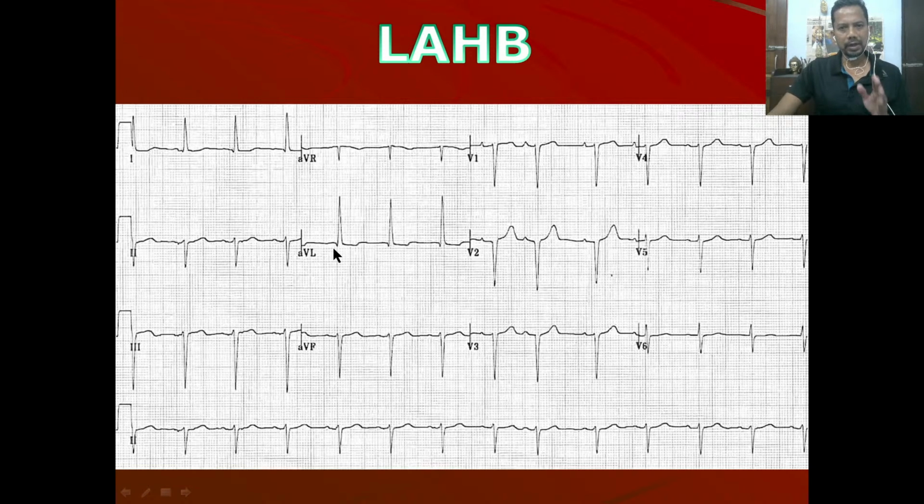Now I told you LBB and LAHB are usually organic blocks. The patient has a CAD in that case. Now you look at the R waves, small r, no progression, V3 no R, V4 no R, hardly any R. Okay, so old anteroseptal MI.